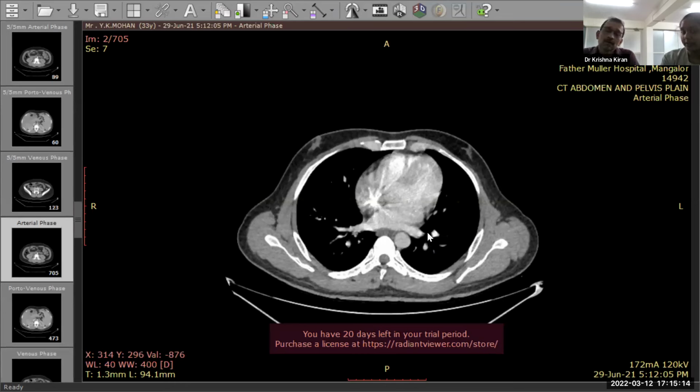In this, we see the hypervascular lesions in the liver, because only these will enhance, as the liver has still not enhanced because the portal vein is still not fully opacified.